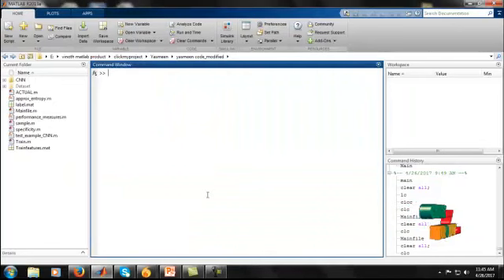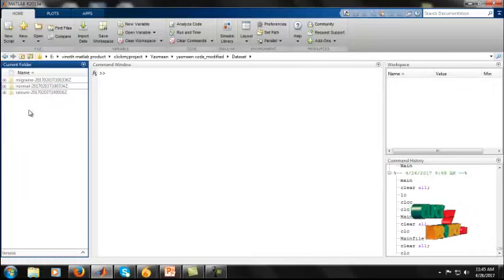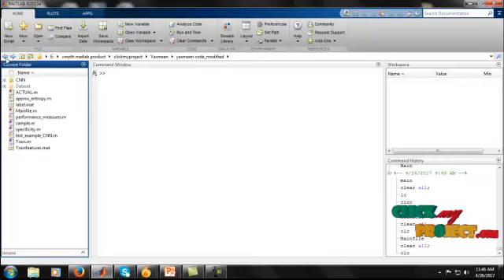The project source code file was run from the command window. The current folder shows some files, which are our source code files. In this source code, we are getting the datasets. I have separately 3 different types of datasets. The first one is migraine, which is one of the brain datasets. The second one is normal, which is also a brain dataset, and the third is the seizure detection dataset. So I have collected 3 different types of datasets.